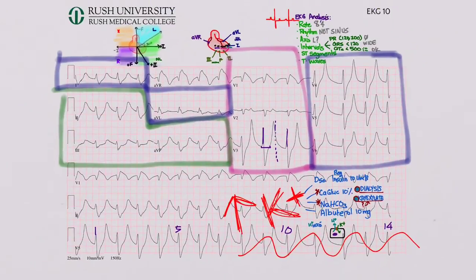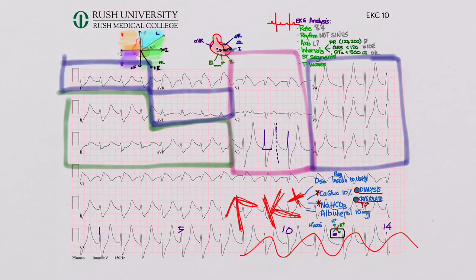Okay, so for this one, this is a really deadly EKG. If you see this, you should start worrying. This is pathognomonic for hyperkalemia, and so treat the hyperkalemia somehow. Calcium gluconate or sodium bicarb. You can do the other things, albuterol, insulin, and glucose, and then get some Kayexalate or dialysis somehow. You're going to call renal, and you give them the Kayexalate and hope that that stuff will work later. Okay, we've got one more EKG we're going to look at, and then we're done.